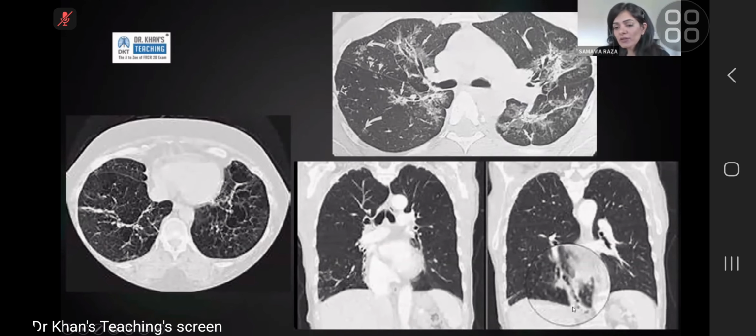But because this is so long, as in so smooth and linear looking, even if it is a bit thickened, the likelihood of this representing underlying cancer is low. So again, I would describe it, but I would dismiss it. I wouldn't recommend follow-up.